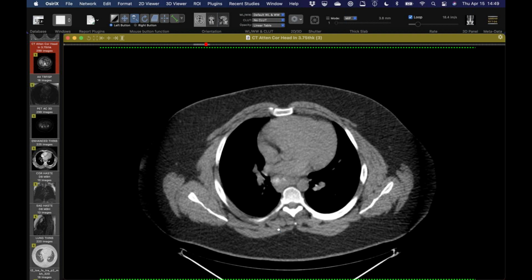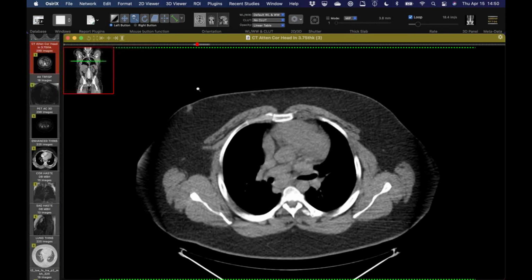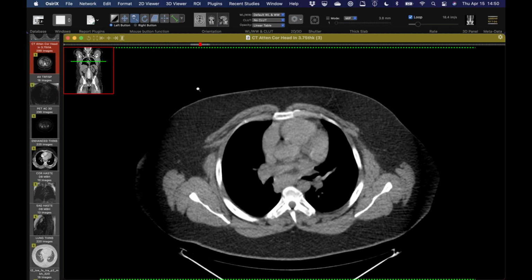And so that actually makes me more confident that this is histo, and hoping to avoid the freight train of pursuing biopsy and all this. But we've talked recently about exuberant lymphadenopathy in histo, and we showed some calcified nodes. I think this is an example of a patient whose nodes haven't quite calcified yet. Here's the non-con CT, and you can see that faint calcification in it.